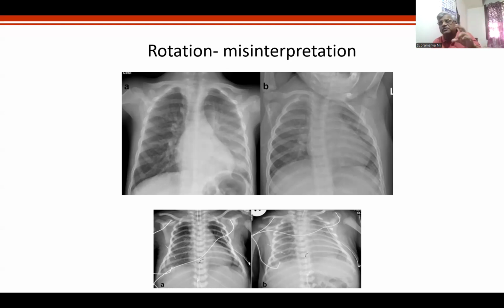This is very, very important for you to radiologically interpret and understand that various structures inside may appear more lucent or more radio opaque. This fact should be taken into consideration when you make a diagnosis of pneumonia. I have been seeing many. I'm sorry, Dr. Nagmani, there is nothing like a vertical rotation in any textbooks.